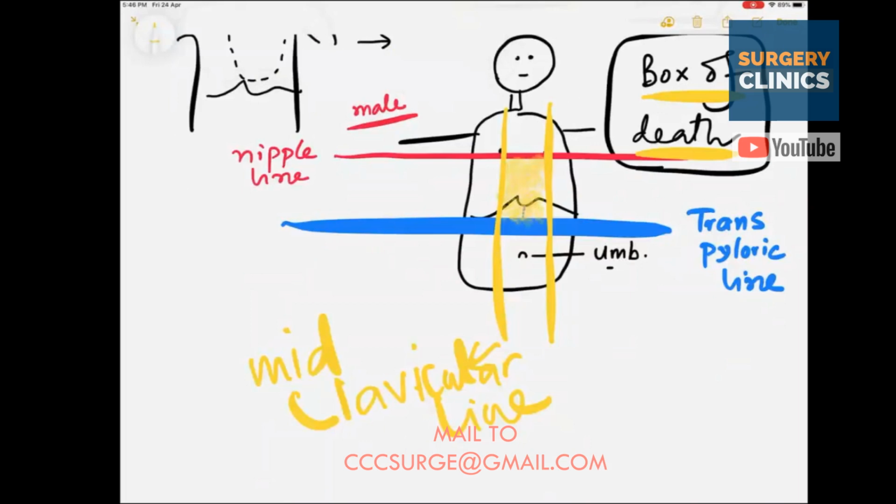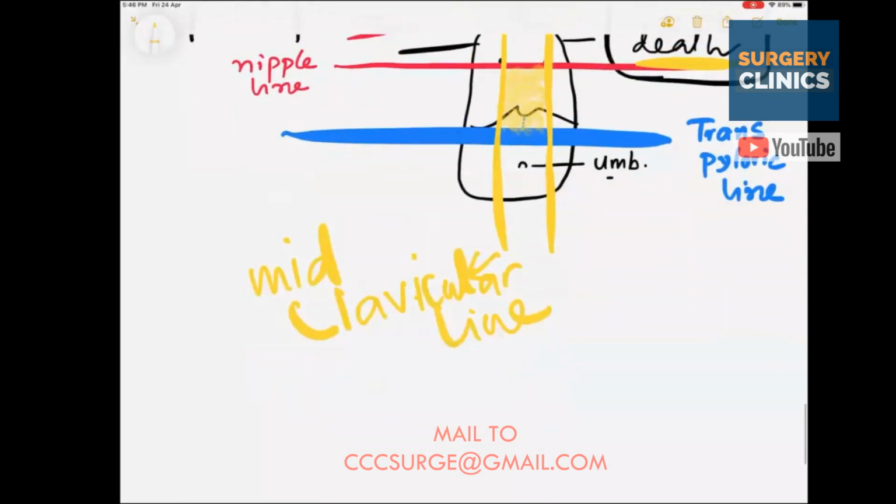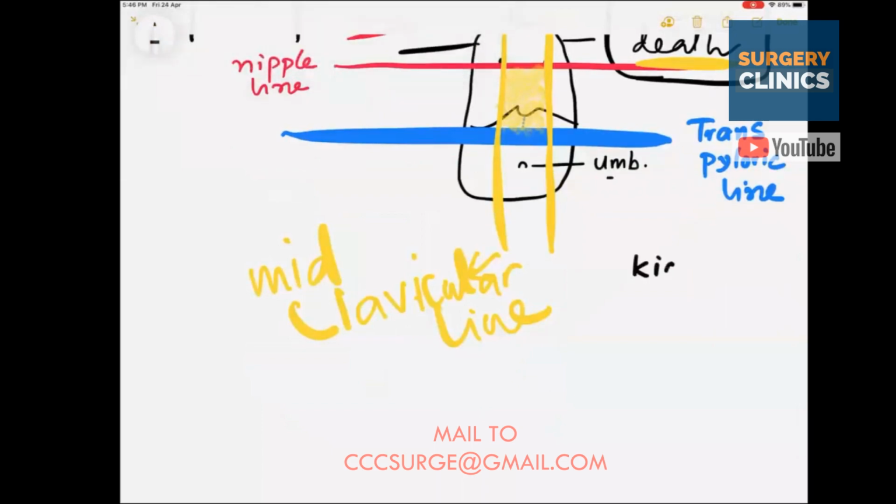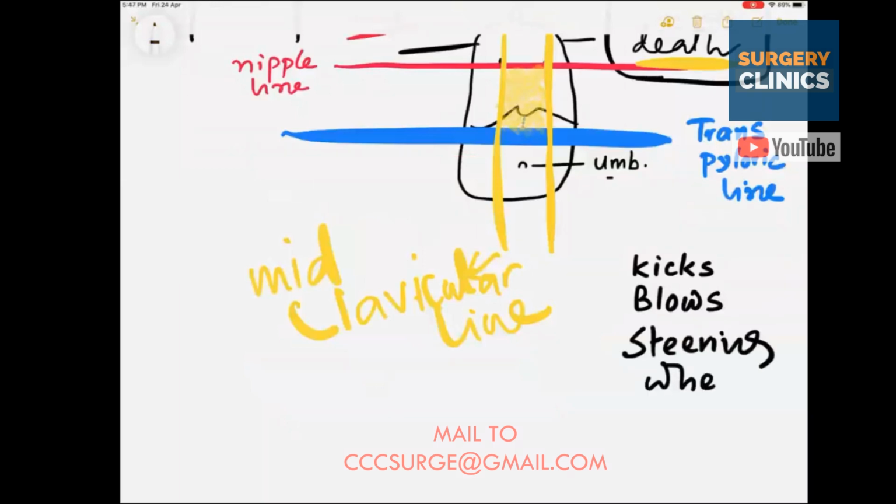Now, what is interesting is that this bounded area is where someone gets a kick or a blow or any steering wheel injury. What we get as surgeons in our practice are usually kicks, blows, and in automobile accidents, steering wheel injuries.